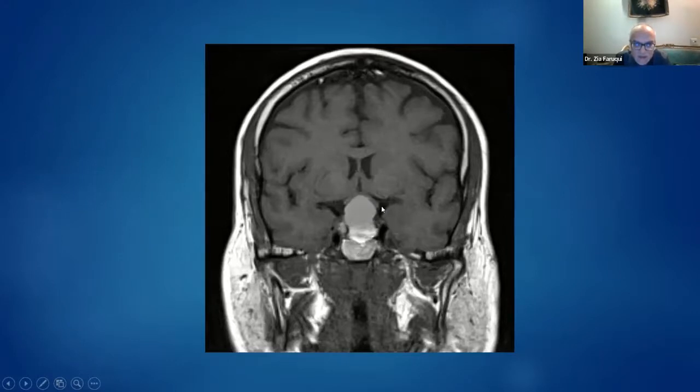And this is supposed to be a fairly typical sign for pituitary adenoma because of their soft nature. Remember, the problem is it's a small area, and the bigger the things become, the harder it is to tell where they're coming from. So you need to look for ancillary signs such as this to suggest that this is a pituitary lesion and not a meningioma or other pathology.